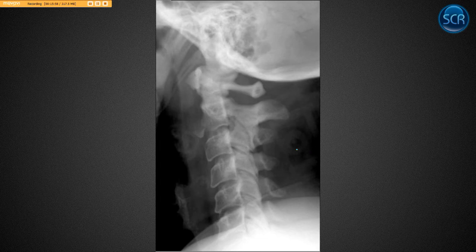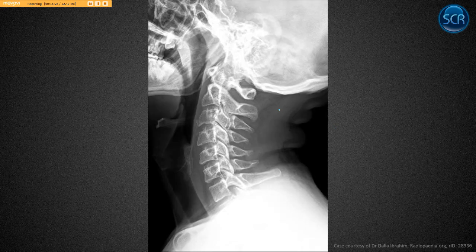Here's an example of someone who had a hyperextension injury, and we can see they avulsed off their inferior vertebral corner of their vertebral body at C2. So they probably tore their ALL in combination with this, but that hyperextension back here just extended their head back the way it's meant to go, and so these just compressed, which they're designed to do. So this is a one column injury, stable, but probably is going to require a collar for some time. Here's another example, a bit more subtle.